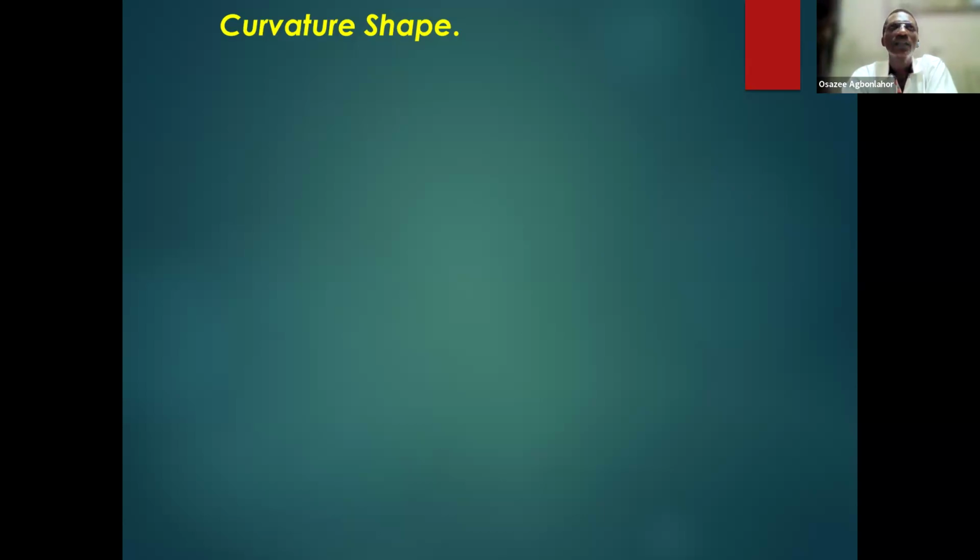And one of the ways to stop that from progressing is what we call corneal cross-linking, where you try to strengthen the stroma bed, creating an epithelial flap, using some riboflavin and exposing it to UV rays to strengthen the stroma bed. At that point, the cornea becomes stronger and doesn't progress further. So what I'm trying to say is that the most curved part of the cornea is actually the steepest part of the cornea. Please take note of that.